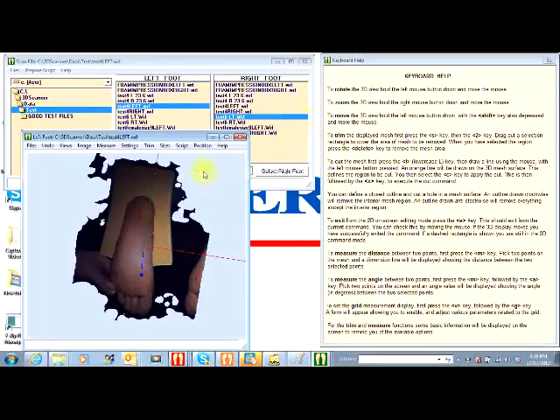By opening up the help key, you'll see that you have this keyboard command list you can open up and refresh your memory. But essentially speaking, using a lowercase L, if it doesn't work when you press the L, it means you've got the caps lock on. You can go L, and if you draw a line in an anti-clockwise direction, then you go C for cut, X for exit, and it removes what's on the outside of the line.